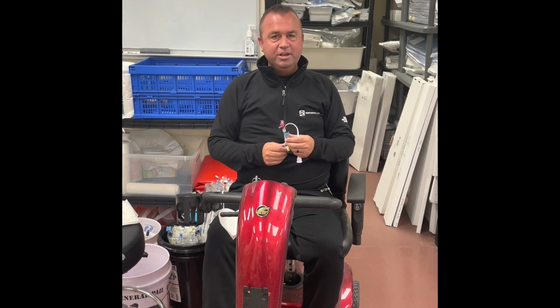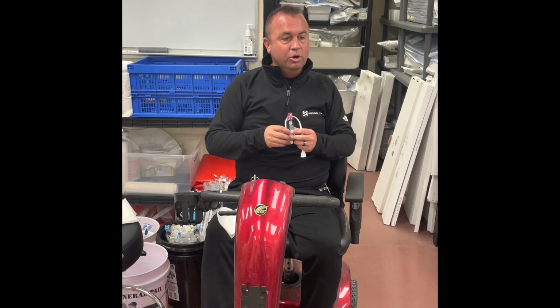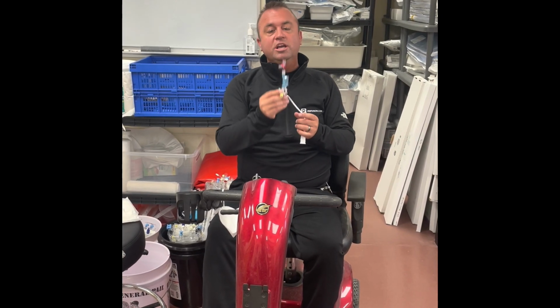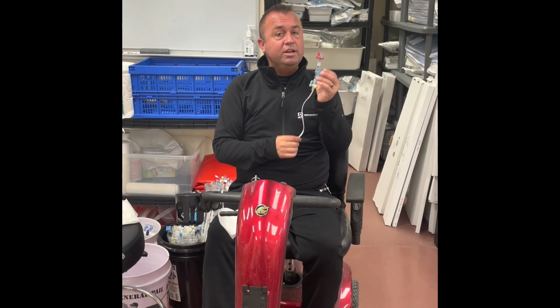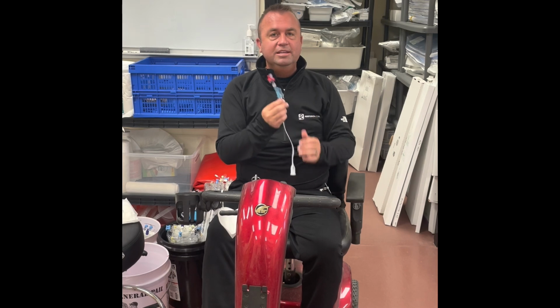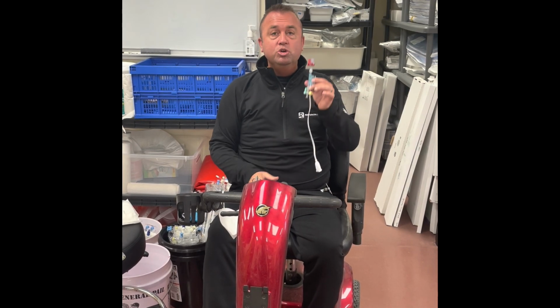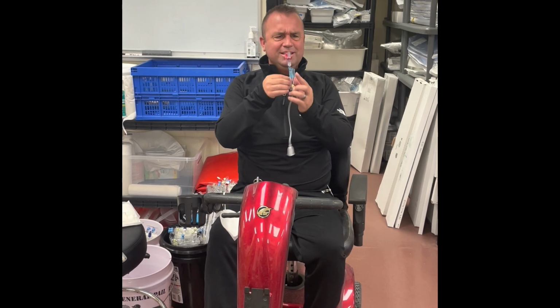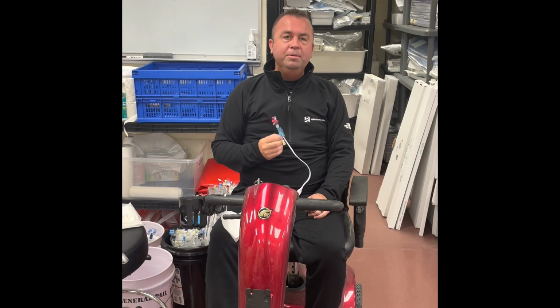Obviously, it's kind of a trick if the surgeon is upset that the pressure is way too high or way too low for a given time before the drugs can work, you can always slide that pressure transducer. It's kind of a trick to trick the monitor into seeing a different pressure. We obviously don't advocate that, but you can quickly manipulate the blood pressure simply by moving the transducer and the pressure clip up and down the IV pole.